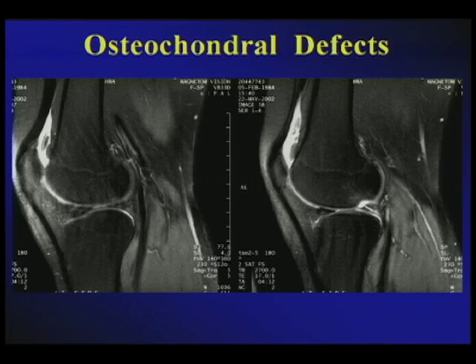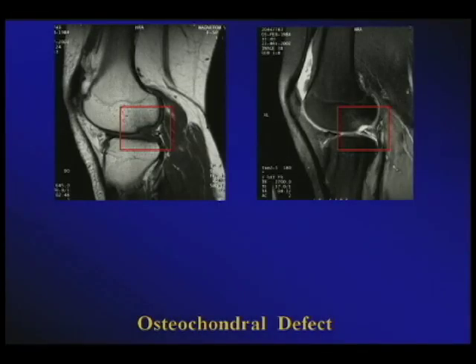Once you've detected this on MRI, ultrasound can play a role in this, because now you do have an acoustic window. You can approach the knee posteriorly and again confirm the same changes that you appreciate on MR. Here on the left image, you see the morphologic sequence representing the divot. And then you've already seen the fluid-sensitive sequence showing you the same defect.